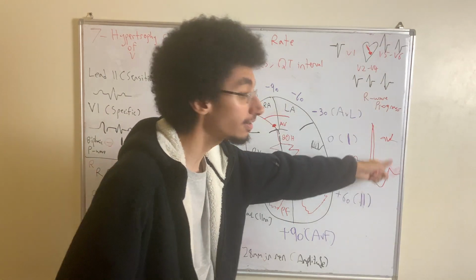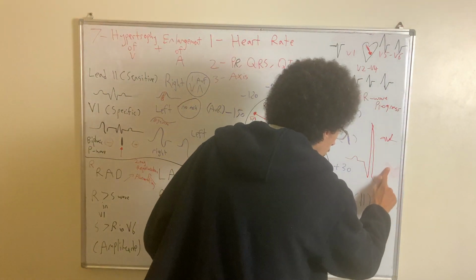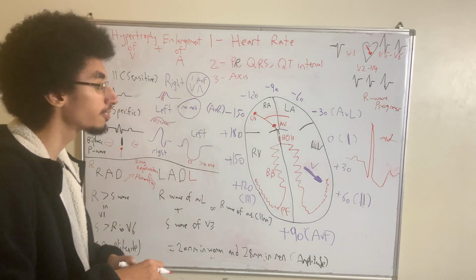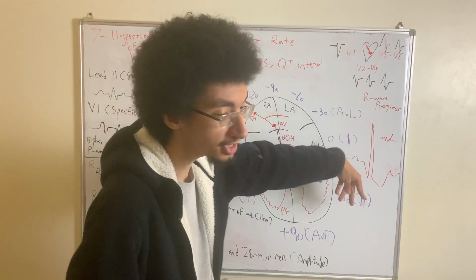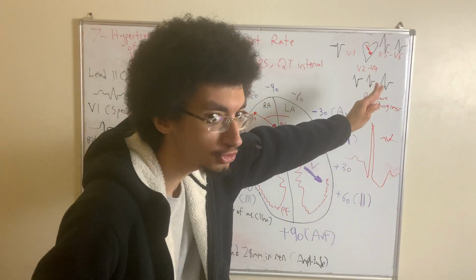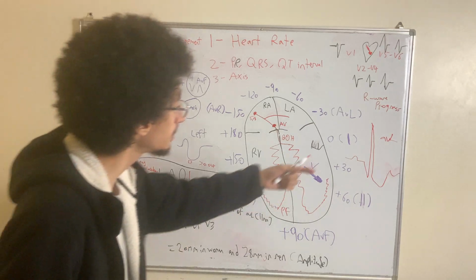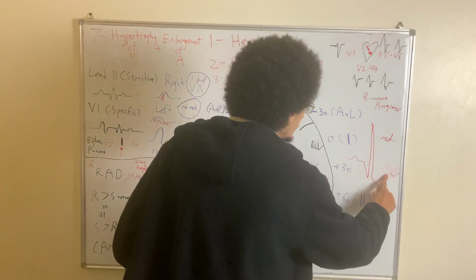And then once you go beyond this ST segment depression, there will be what? There will be a T wave inversion, which suggests ischemia. So you have a downslope ST segment depression, a gradual downslope, then a rapid upslope, and then you have a T wave inversion. And in such a case, it is asymmetrical. You have an asymmetrical T wave inversion. What does it mean? Now it's asymmetrical. It's not even clear, right?